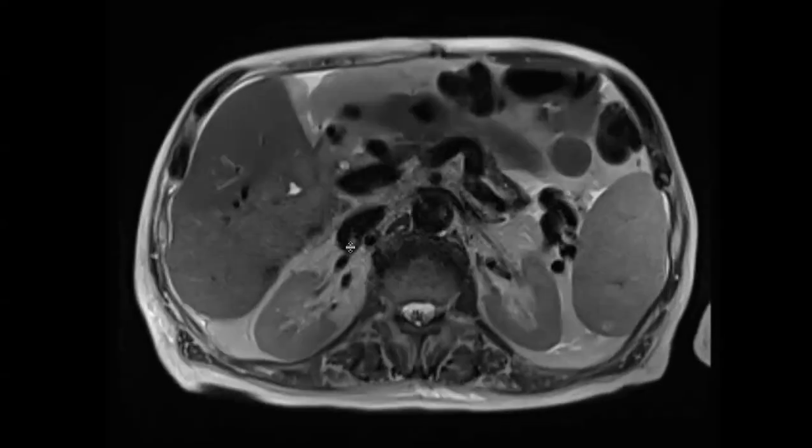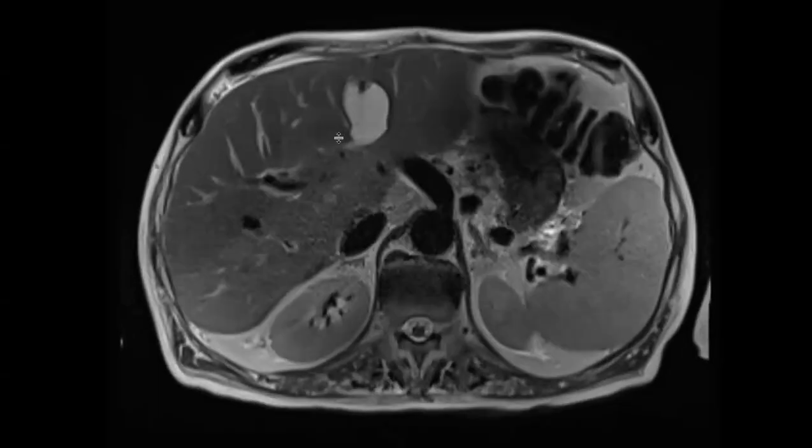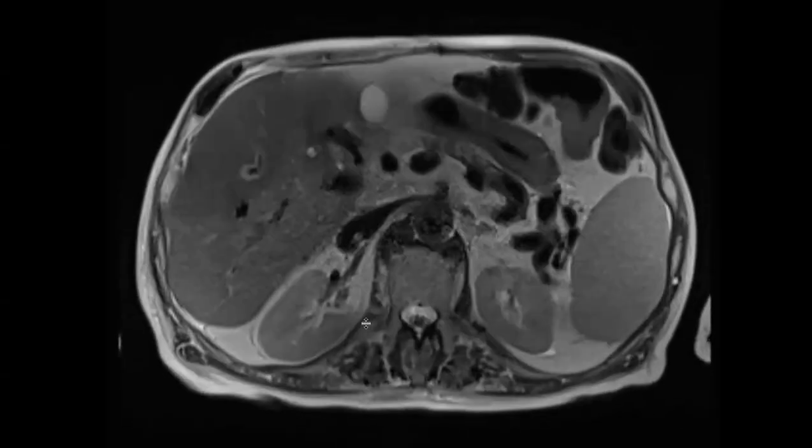The patient did have frank pus when they did the ERCP for the biliary anastomotic stricture. So the question is, how do you distinguish infected cholangitis from PTLD? Obviously FDG uptake. In addition to that, you lose the interface, you lose all the fat in the hilum. There's a mass forming process that is subtle, but it is there. That's been progressing over time, with all of this mass effect.